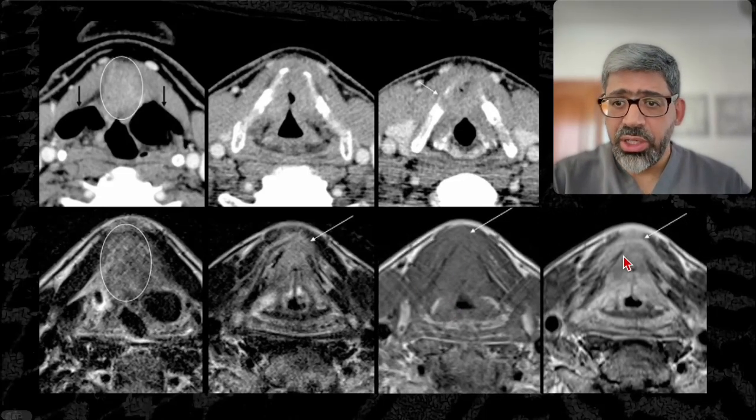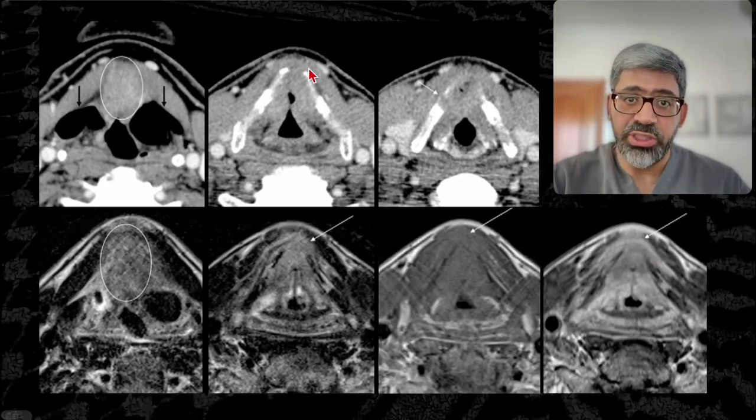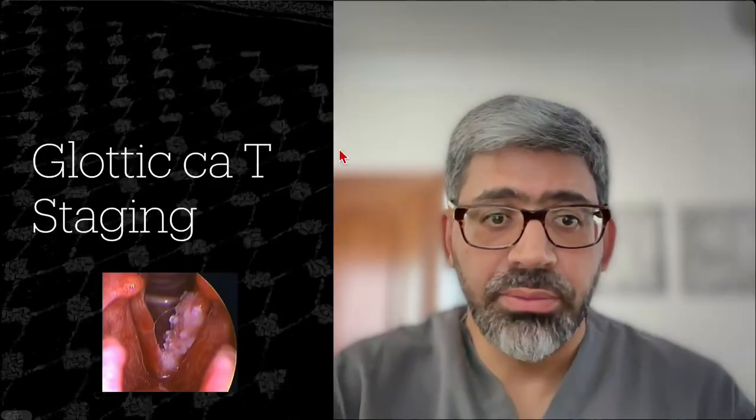This is T1 and T1 post-contrast. You can see also the tumor and the intermediate degree of contrast enhancement. On post-contrast imaging, you still can easily discriminate between the tumor and the strap muscles. On CT, they all look similar and cannot be distinct.